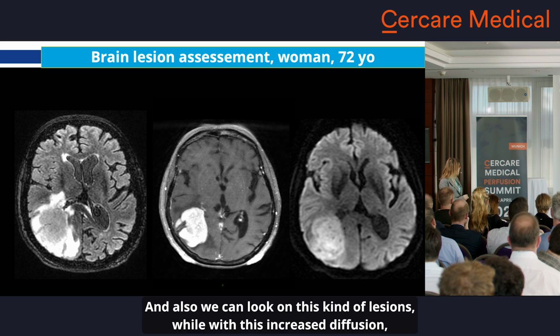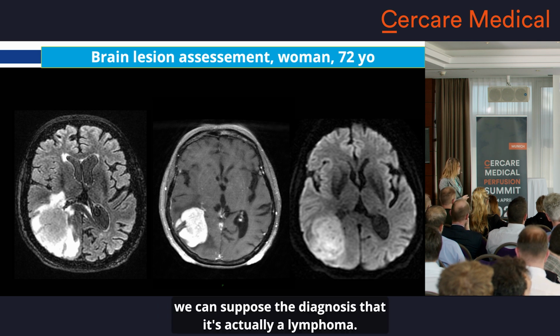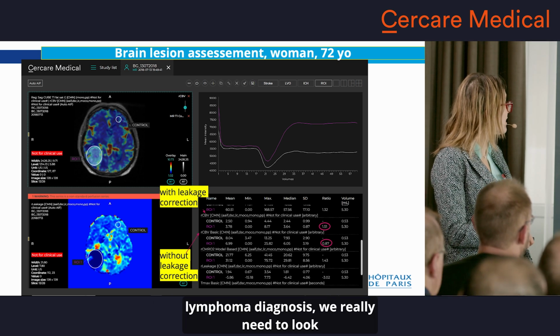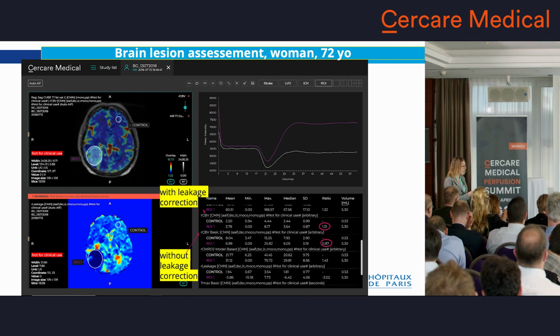And we can also look at this kind of lesion. With this increased diffusion, we can suppose the diagnosis that it's actually a lymphoma. But what's interesting is that, of course, when we analyze the perfusion for lymphoma diagnosis, we really need to look at the leakage and the leakage correction.